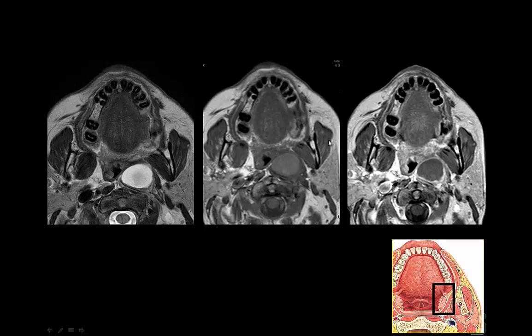Now, this was an interesting case. Again, this was one of my misdiagnoses because I looked at this and I thought that this was just going to be a tonsillar cyst or a retention cyst. You know, one of the papers I'm still working on at my own institution, we have 140 cases of pathologically proven branchial cleft cysts or branchial cleft anomalies. And we're sort of familiar with the Bailey classification, and Dr. Sam showed some typical second branchial cleft cysts.